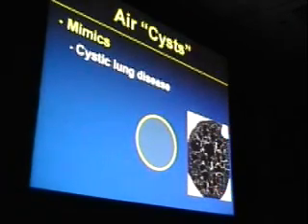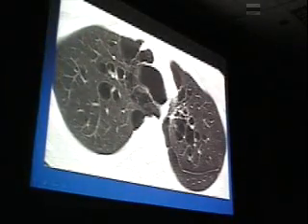By way of contrast, our patient with EG, notice again that the cyst walls are rounded in shape, and because these are space-occupying lesions, they tend to displace the centrilobular artery to the periphery of the cyst. So we don't see any central dots within these air-filled cysts. They're all at the periphery. They're regular in shape. They have rounded contours. This is a cystic lung disease. These are very irregular, variable in shape. We would favor histiocytosis X, EG, etc. in this particular case.